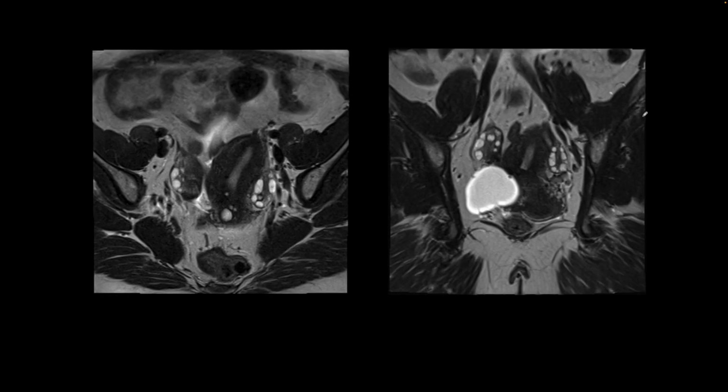This is our next patient. We have two images. These are small field of view axial T2 weighted images, and a small field of view coronal T2 weighted image in a female, showing normal appearance of the right and the left ovaries. Also seen right here, there are Nabothian cysts in the cervix, but the finding is in the uterus. Look at the abnormal contour of a small uterus, and this finding is consistent with the unicornuate uterus.